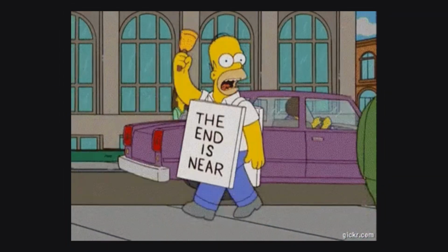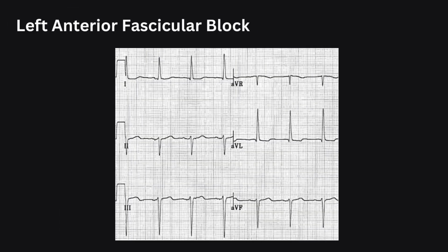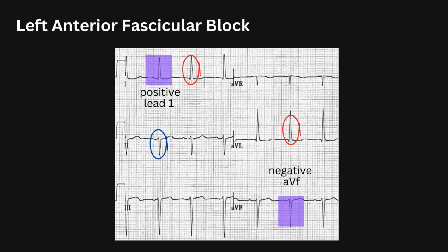Lastly, let's briefly go through the remaining conduction blocks. In LAF, or left anterior fascicular block, there will be left axis deviation, QR complexes in leads I and aVL, RS complexes in leads 2, 3, and aVF. Prolonged R wave peak time in aVL of more than 45 milliseconds, as the impulses reach the left-sided leads later than normal.